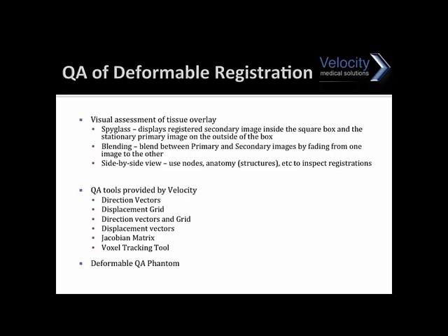So we have navigators that can do various options, and today we're going to focus on registering the CT sim with the PET CT. As we spoke, we can't register the PET directly to the planning CT. We've got to take the attenuated CT that is linked to the PET with a DICOM registration, and register that to the planning CT. Now the planning CT will be the primary volume, so that is the center of our universe. And once we've registered those through the deformable registration, we can just chain the PET to the planning CT.